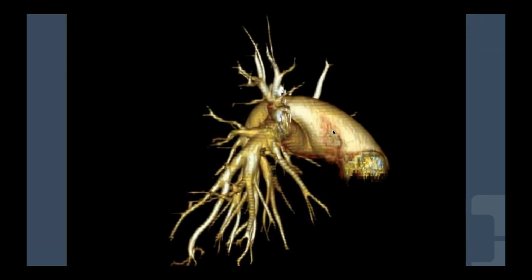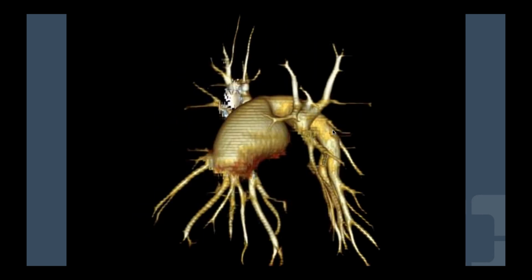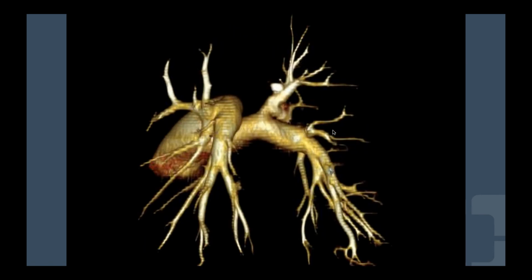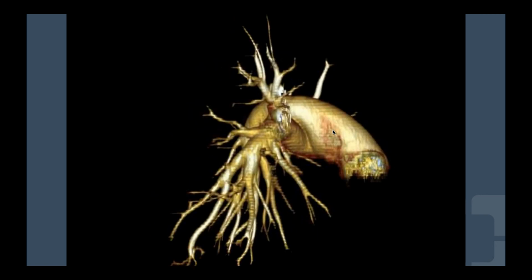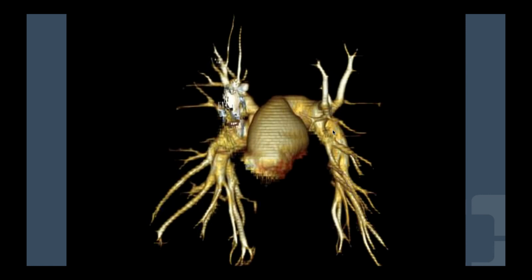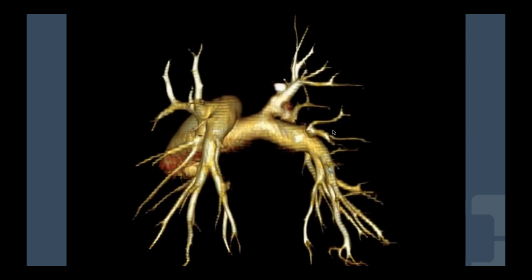I would suggest that maybe the left contour here at the region of the left atrial appendage is a little bit more prominent than usual. Maybe the pulmonaries, although when you see the branches of pulmonary arteries and veins here, the vasculature doesn't seem to be engorged, but definitely there's a bit of a bump here that seems more than we usually see.